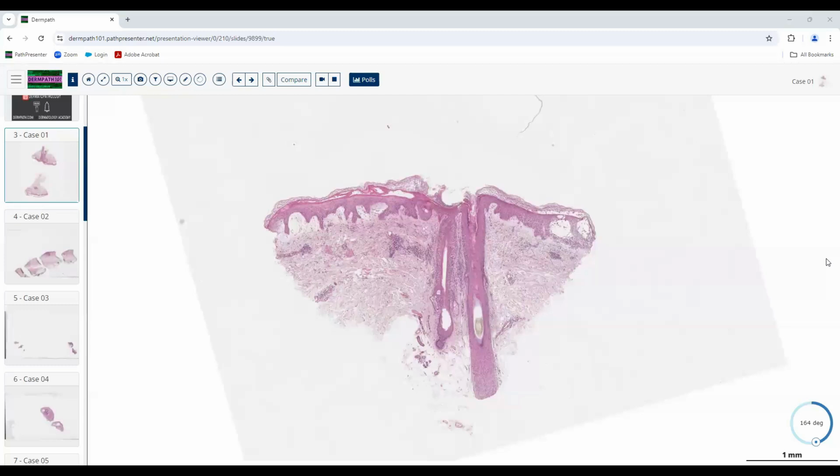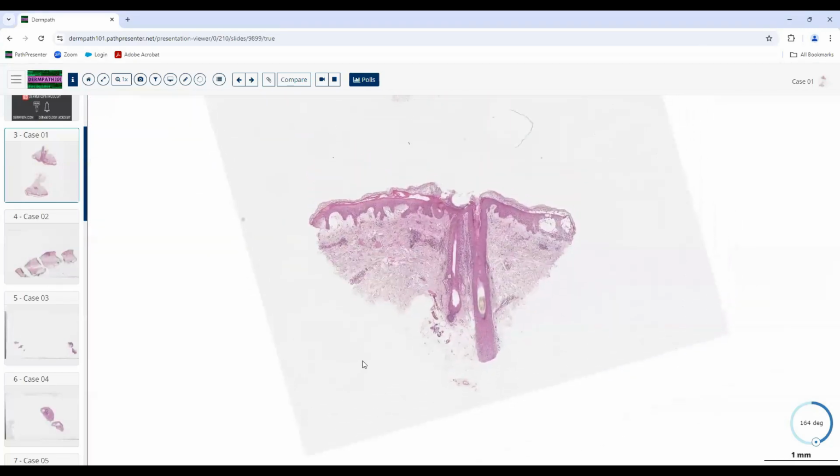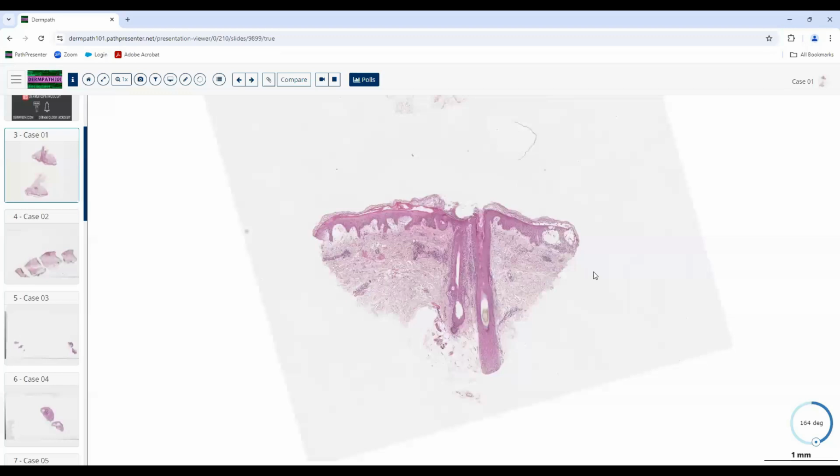likely a rash. I'd put this as a big inflammatory process. Yes, inflammatory process. I'd put it in the spongiotic eczematous bucket. Okay, good. There's spongiosis in here for sure. Yep. And then a little bit of inflammatory infiltrate in the dermis.